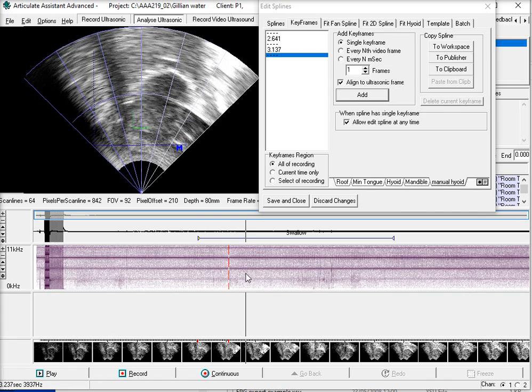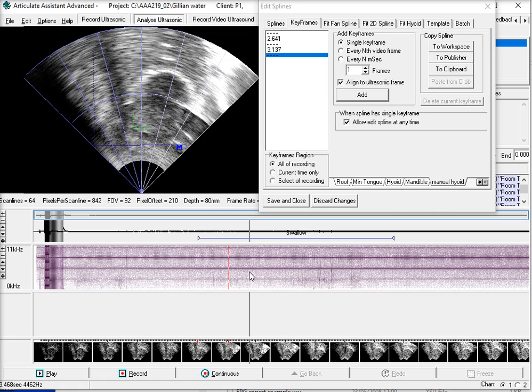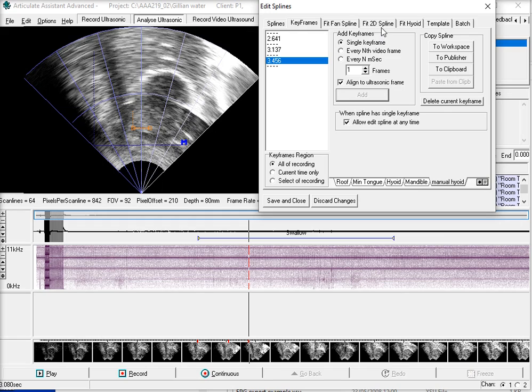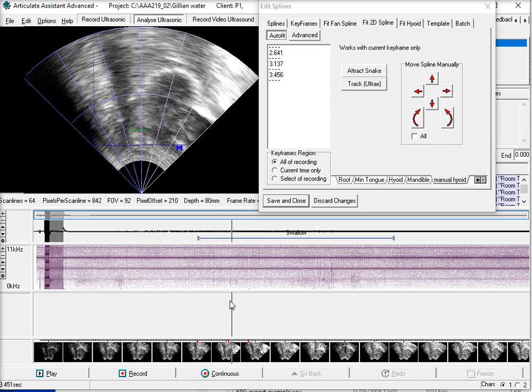Now, you can put in as many keyframes as you like, but to save effort, you can sometimes move just till you see the one transition end, and then click another time point keyframe, and then at this keyframe we can move that into position.